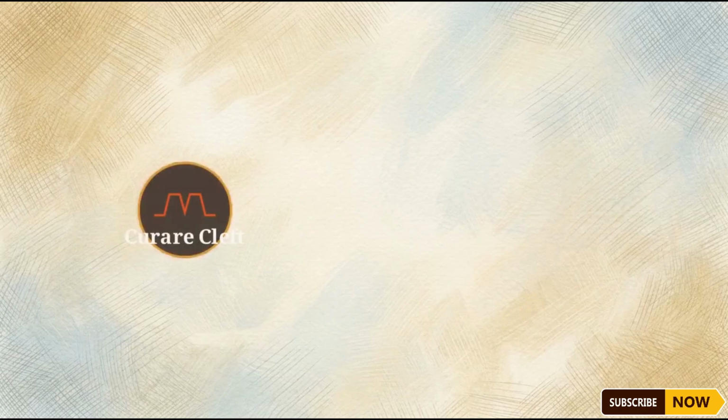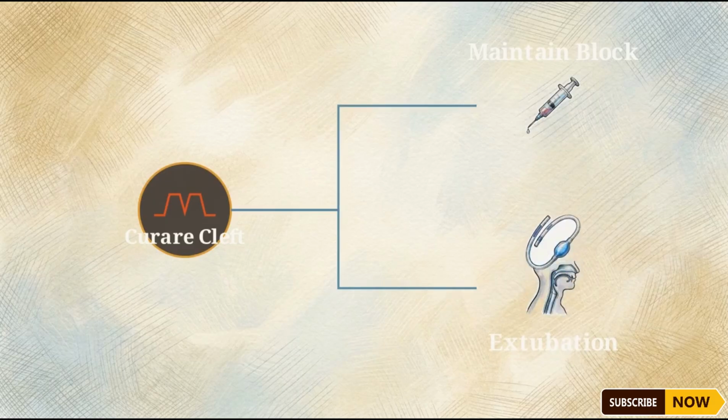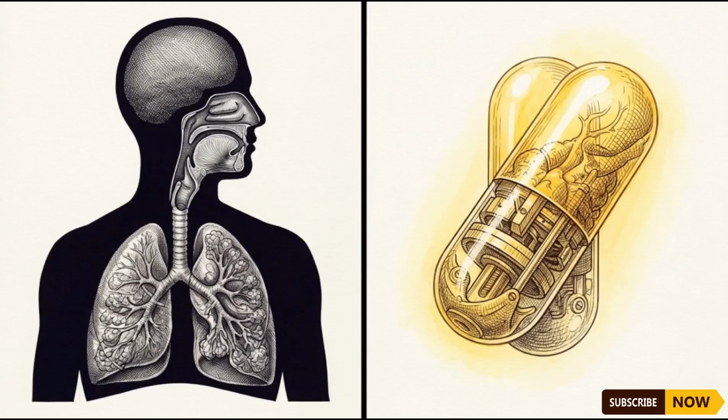When you see this dip, it confirms the surgical muscle relaxants are actively wearing off. You now have a clear choice: either push more paralytics to maintain the block, or begin preparing the patient for extubation. Notice the pattern. When structural alterations occur along the wave's top plateau, the problem is locked inside the patient's physiology, requiring a pharmacological solution.